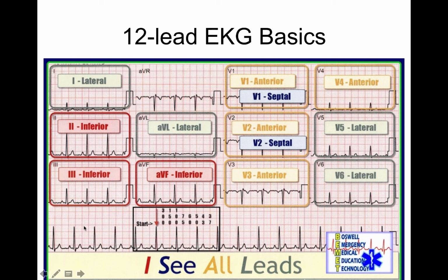So what you want to say to yourself when you're looking at this 12 lead is that we're looking at ST elevation in 2 or more contiguous leads. If I have ST elevation in just one lead and not the other one that's associated with it, we cannot qualify by definition that this is actually a heart attack.